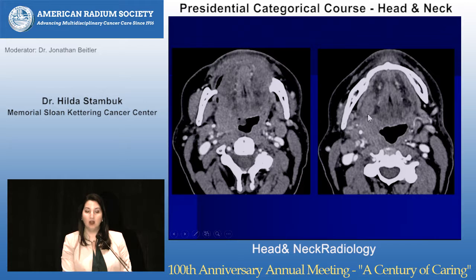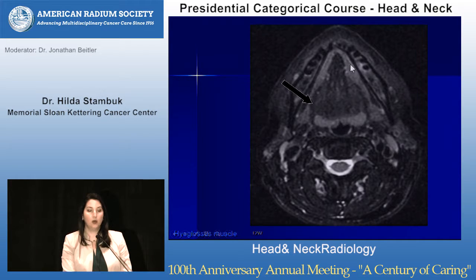But this muscle also shows you where the neurovascular bundle runs for the oral cavity. And this is something you'll see in the oral cavity lectures, about when patients go up for oral cavity resection, can you spare one of the neurovascular bundles if you're going to do surgery or not? So with this tumor involving the muscle, you have the neurovascular bundle, which is cranial nerve 12 medial to this muscle. The lingual nerve is lateral, so you may get cranial neuropathies as well, and I'll prove that to you in a minute. So on MRI, I'm going to show you the normal hyoglossus muscle.